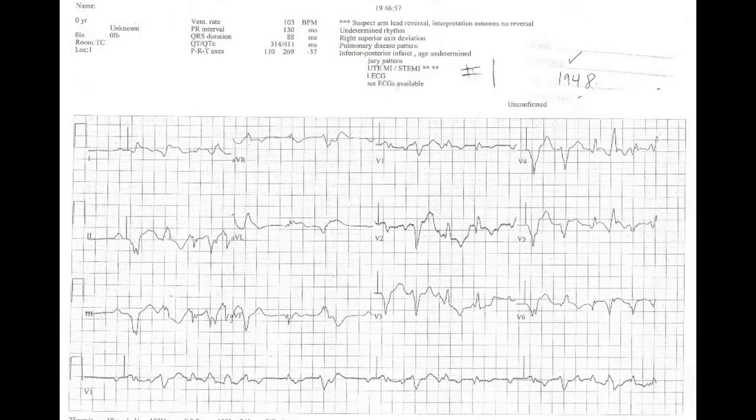My goal here is to do a quick analysis of a 12 lead in a way that non-paramedics are going to find meaningful as well. So I'm not going to go into a tremendous amount of measurement and detail and super analysis here, but I do want you to know what it is we're looking for. So this is the first 12 lead here.